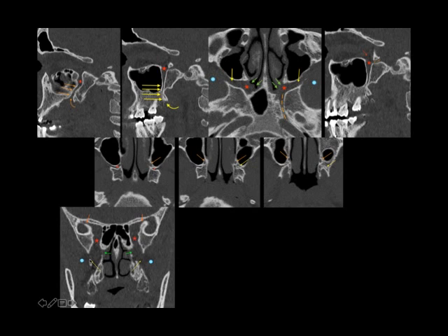So this was again the coronal section of the pterygopalatine fossa. We saw that it was opening into the infratemporal fossa, but just to highlight how it goes into the inferior orbital fissure. So this is the anterior part of the inferior orbital fissure, and it is extending into the inferior orbital fissure along the pterygopalatine fossa. So, sorry.